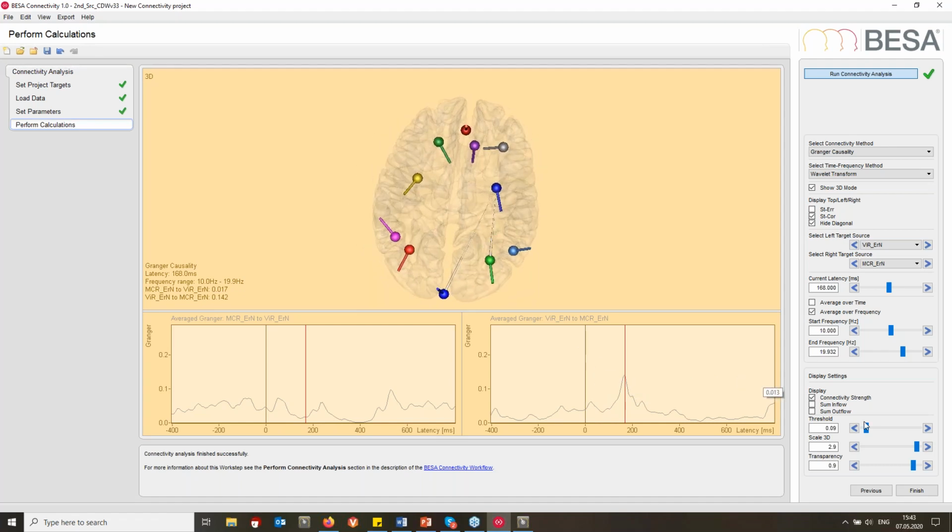And then I can see, okay, these are very small connectivity. So there's mainly this thing going on in the right part here. Again, in the correct condition, in the error condition, there's hardly anything happening at this frequency range. But in the error condition, I can go back to lower frequencies now.